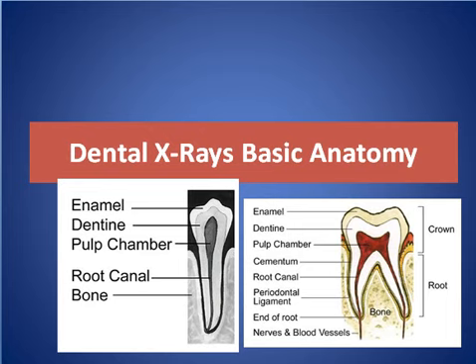As we know, dental X-rays see the tooth and beneath the gum to assess the health of the bone and supporting tissue that hold the teeth in place. And there are a number of X-rays for the dental profession, which can be divided into intraoral and extraoral. The intraoral is the occlusal film, and the extraoral is the panorama and the CT scan.